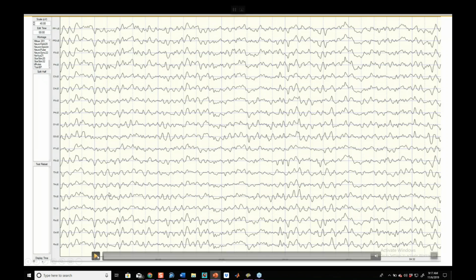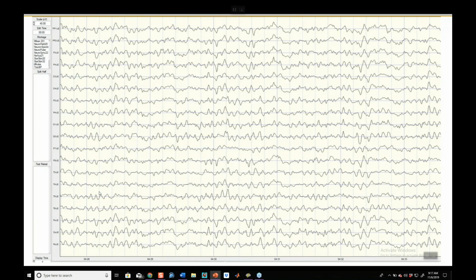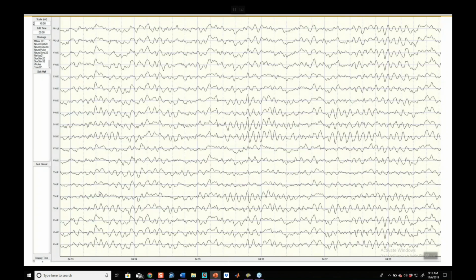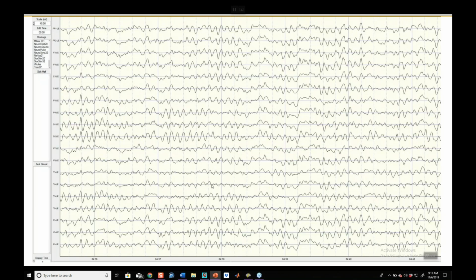So in this record, we have a really sneaky example. And as I cruise my mouse around, what I'm doing is I'm saying, is this record in phase? Is everything moving in lockstep? There seems to be quite a few moments where it is, and that's the trick, is that it's not going to be every single electrode every single time, but it will be frequent enough that you can just go ahead and track, wow, everybody's doing the same dance at the same time, up, down, up, down.